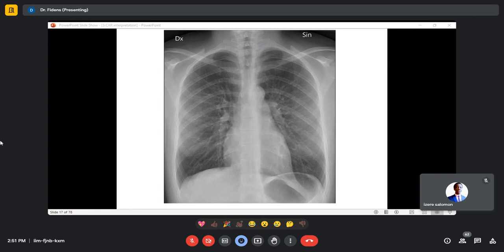Okay, so Emmanuel, can you go ahead, please? Yeah. There is symmetry, because if I see the medial end of this clavicle, the distance.